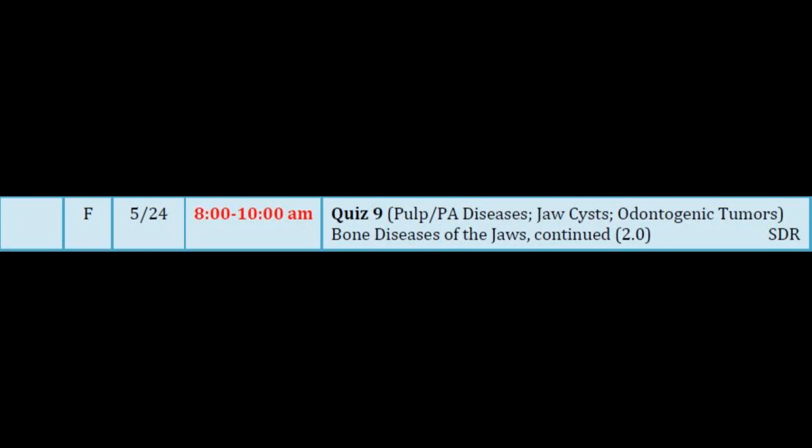Radiographic presentation is also different depending on if it's the traditional common monostotic pattern or the lesser common polyostotic disease. The classic appearance is for monostotic lesions, and it's ground glass bone. Have we seen anything else that produces ground glass bone? Yes, hyperparathyroidism. Is that an expansile disease arising in teenagers? No. So the clinical presentation distinguishes them. Also, hyperparathyroidism is all four quadrants, and monostotic classic ground glass, one quadrant only. So there are lots of ways we can distinguish those two diseases, even though they both have ground glass bony changes.